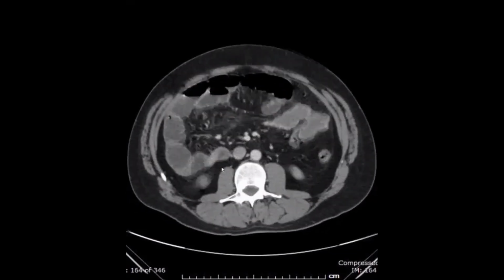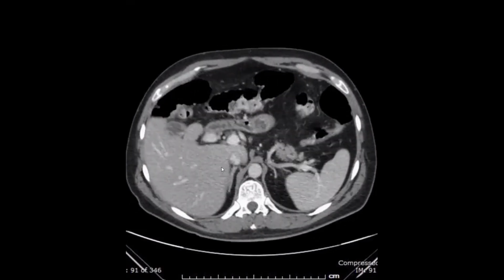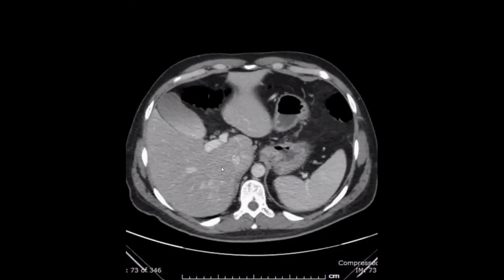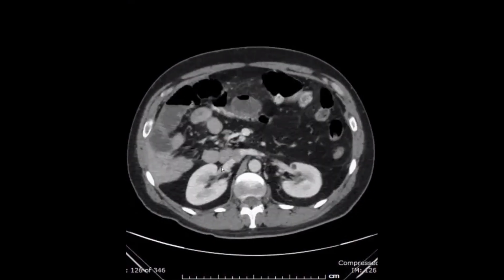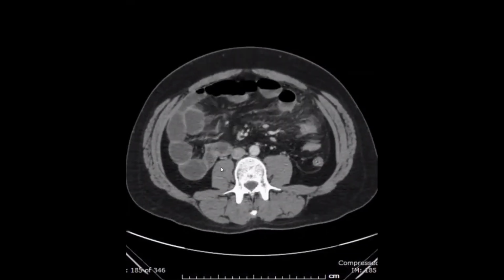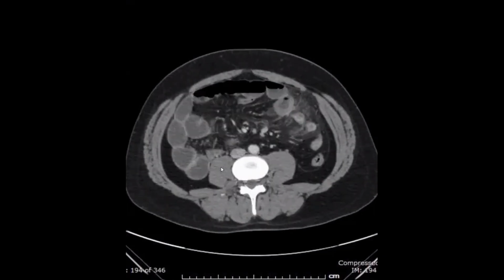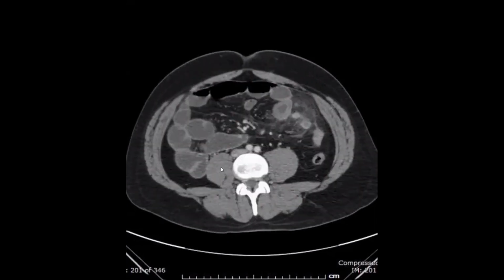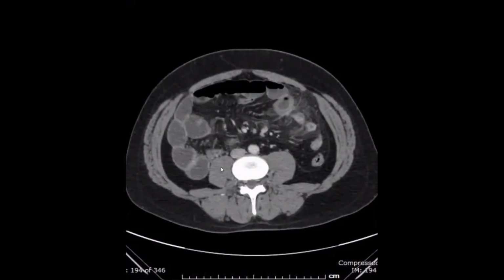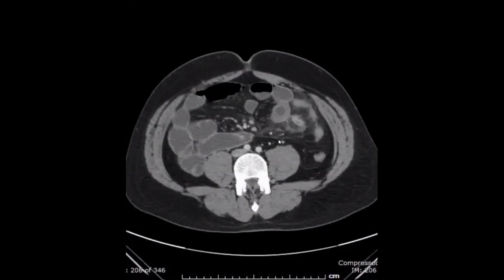I don't have any evidence of ischemic reason, like the vessels are well opacified, and no free fluid or free gas should be identified. Yes, totally agree. I think you got a very important finding, the smudging of fat. At which side? Mild at the left epigastric region or left lumbar region? Left lumbar.